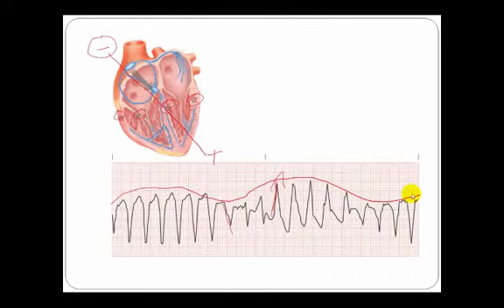This is the Vtach with a pulse algorithm, so both of these can generate a pulse. However, looking at torsades, I would say that if it is generating a pulse, it will not last for very long.